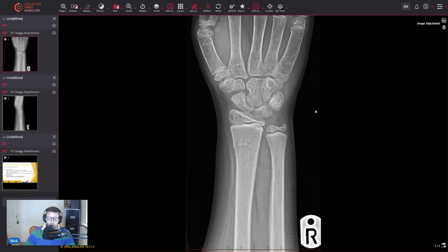These types of fractures, basically, what happens is when the patient falls onto them, in paediatrics, the metaphyseal region is weaker than in adults. So when the patient falls, the force exerted on the metaphysis or diaphysis causes a break in the cortex.